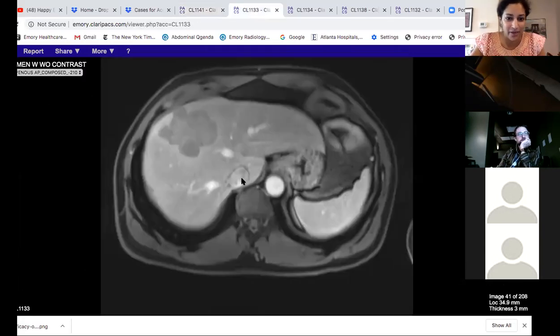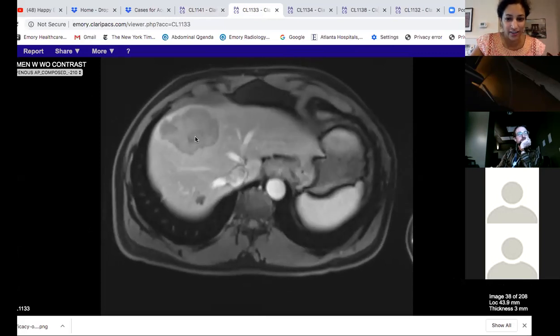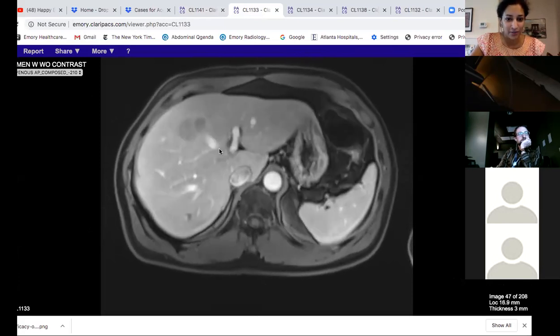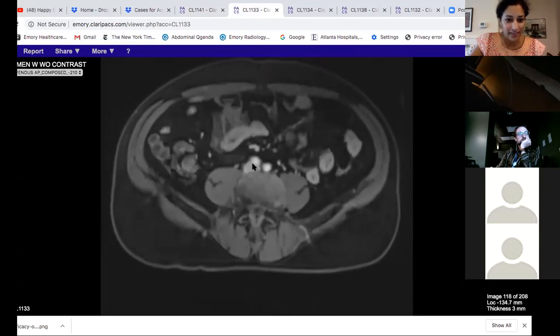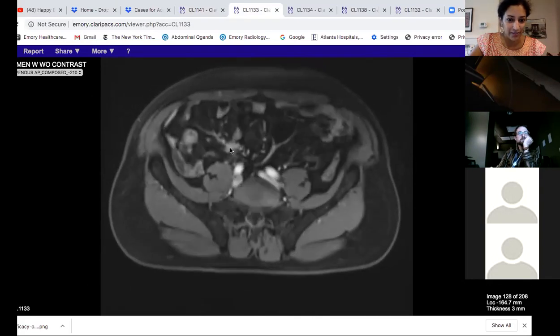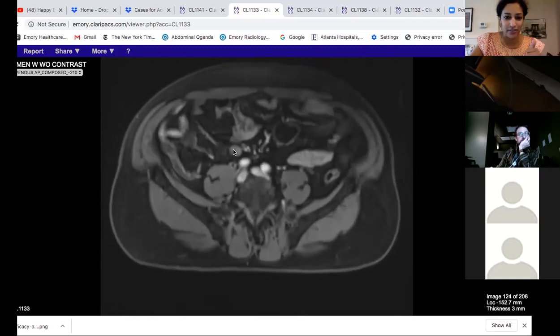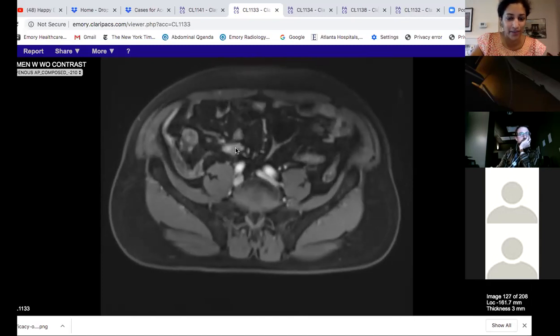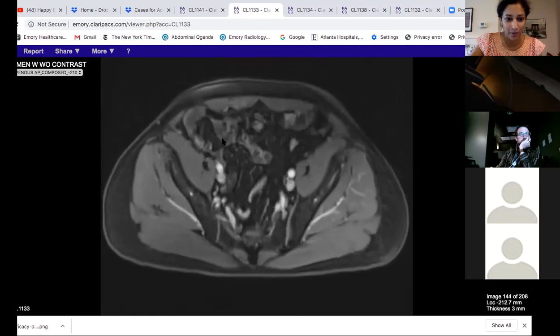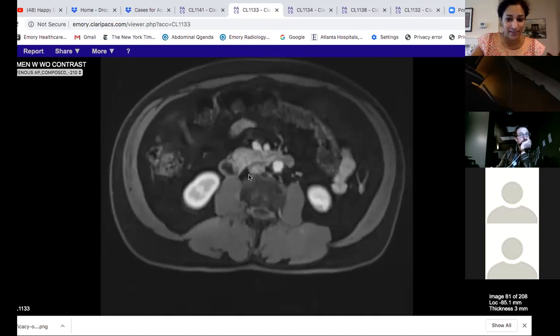And then I have a companion case. This patient had a large liver lesion. It enhanced iso to the liver and then washed out. Anytime you see that, and we don't have definite liver disease here, you always want to think about neuroendocrine tumors and check the mesentery. In this case, we can see the nodal metastasis from their neuroendocrine tumor in the mesentery down here. So the first one was pancreatic neuroendocrine with liver mets, and this one is probably a terminal ileal neuroendocrine tumor. This is the nodal met. We often don't see the primary tumor within the bowel because they're often very tiny and multifocal, but we'll see the nodal metastasis and then the liver metastasis.